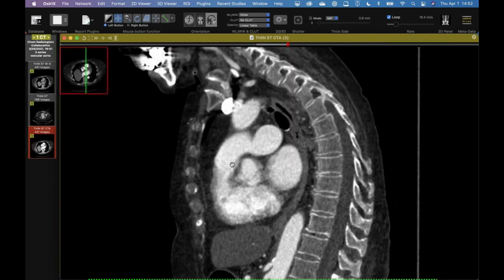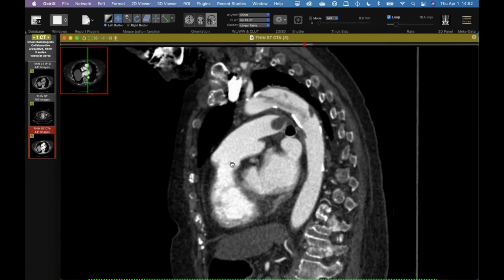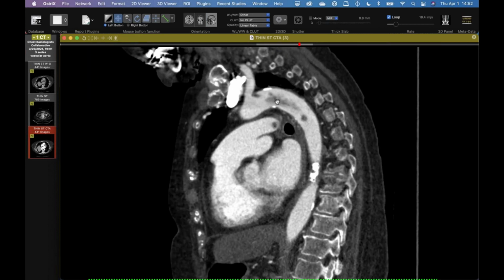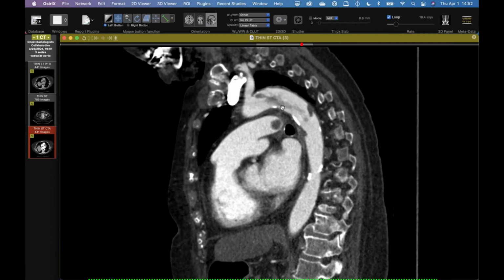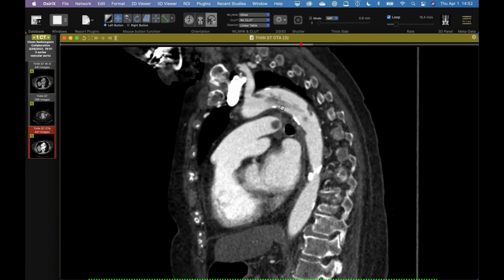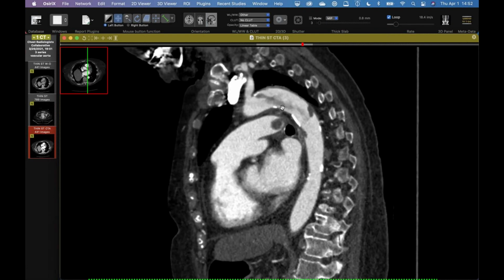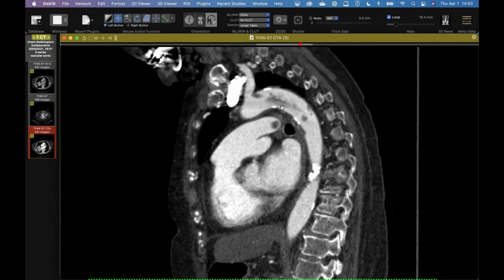And I think one of you showed a really ratty looking aorta that ended up being a sarcoma, but I think this doesn't fit. This is just nice adherent clot and probably some smoke artifact around it from some kind of turbulent flow. But, yeah, I would have really bet there was a PFO, but if there's not, that's great. I don't understand why there'd be both unless they have some sort of clotting issue. Yeah, that's my guess. I'll double check, but I didn't see anything that mentioned it.